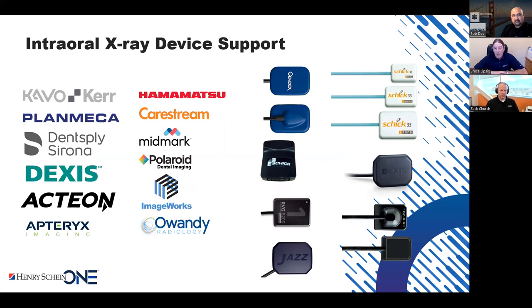As you can see from the screen, it's unlimited. The whole idea is open architecture. Well, as we said, we don't have a horse in that race. Our horse in the race is making our Dentrix Ascend customer happy by making as much of the hardware that they want to use in their practice available and working to the best of its ability.